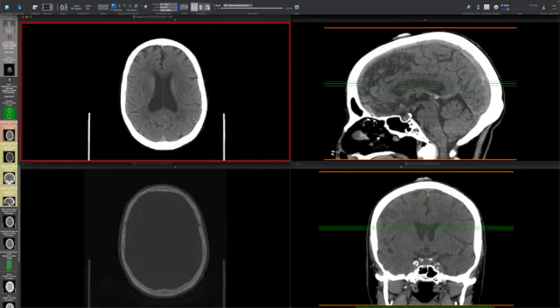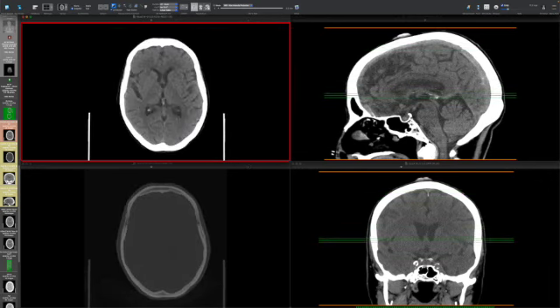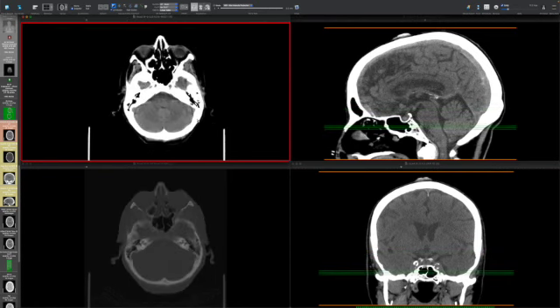And so that's just a basic search pattern for when you're looking at head CTs. Those are the basic signposts on the road, and the way you look at these is really informed by your knowledge of the kinds of things that exist in the brain normally and the kinds of things that can go wrong. But if you start with a basic search pattern, you can hang additional knowledge on that as you get more experienced. So thanks for your attention.